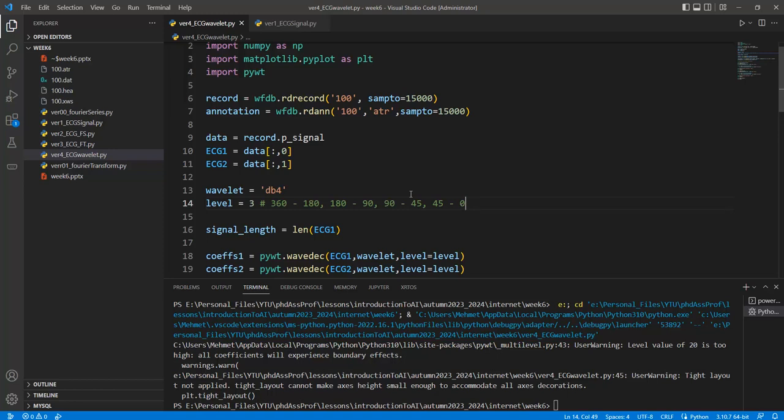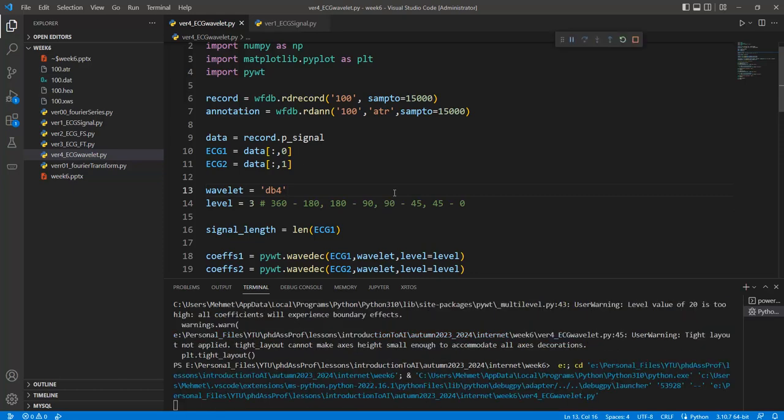The upper values of this code are unnecessary information for the physiological information. In your case, maybe it's up to 200 hertz or 50 hertz. I cannot guarantee. You should always try and catch the patterns. There is no exact answer for this question. You must try it.